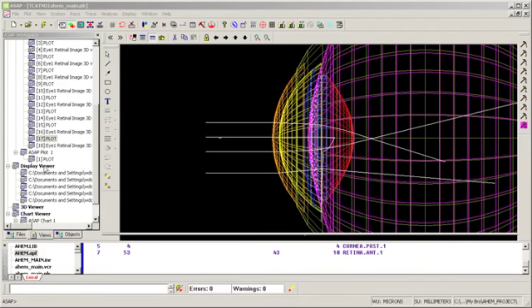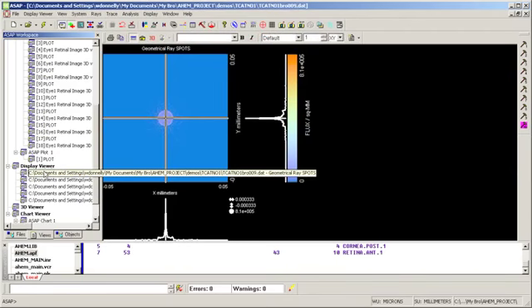All right, so I get a graphic here where I show some rays scattering, but I'm really interested more in the retinal PSF. So this is it here, and if we look at the numbers here as far as maximums go, what I've done is I've set various levels of scatter attenuation. So my particle size is staying the same, but I'm increasing the density of the particle size in the eye lens.